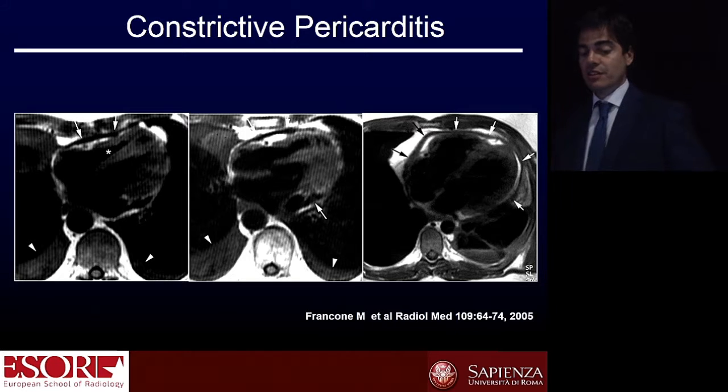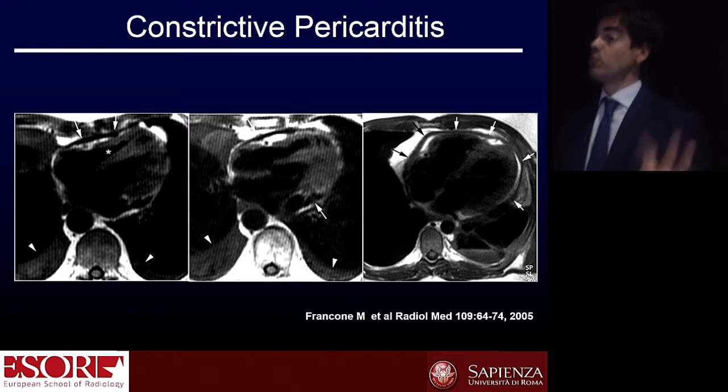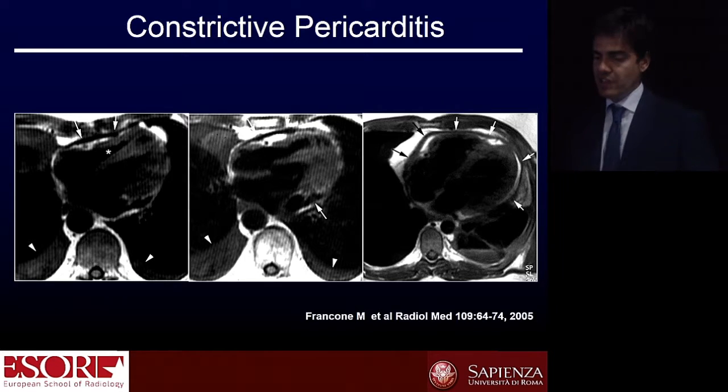On the other hand, these are typical MR changes, consisting of a thickening of the pericardium here, tubularization of the right ventricle, which becomes smaller, and sometimes pleural effusion related to the overload of the right ventricle. This is morphologically what we see in pericarditis.